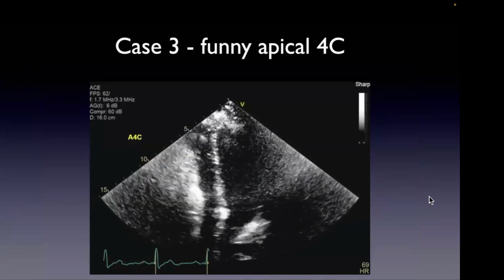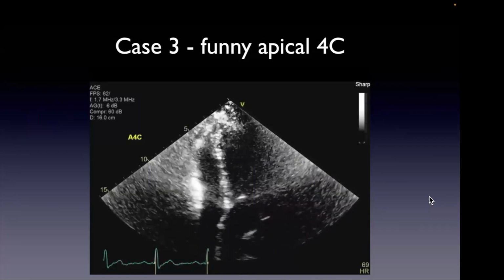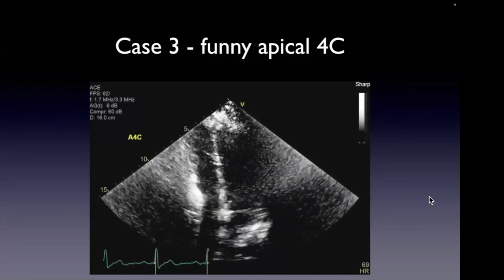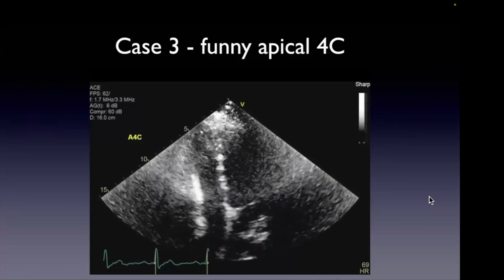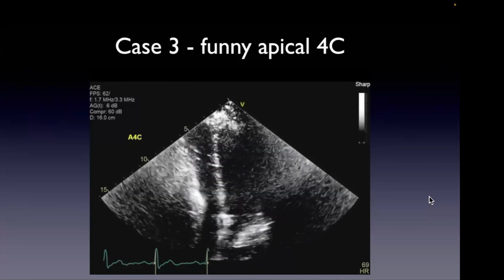This is something that you see and you know exactly what it is. Sonographers know this. Apical 4-chamber view. Looks like an extracardiac mass compressing the RV. Yeah, there's something compressing the RV. Okay, it doesn't have to be a mass. What's it? Hernia.